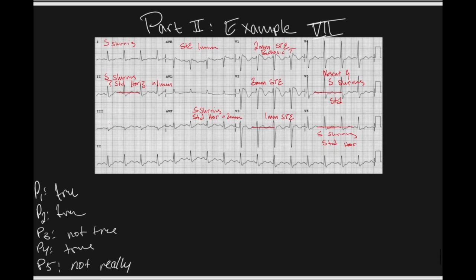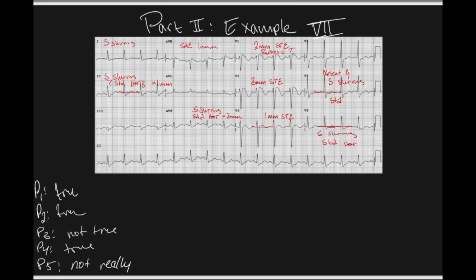So, a little quicker to go through these. So we can see that this method is great for practice, but can also be adopted to be a little quicker for looking at real 12 leads. But all in all, we seem to have some contiguous ST elevation, some contiguous ST depressions, right, and some S wave slurring throughout. Interesting.